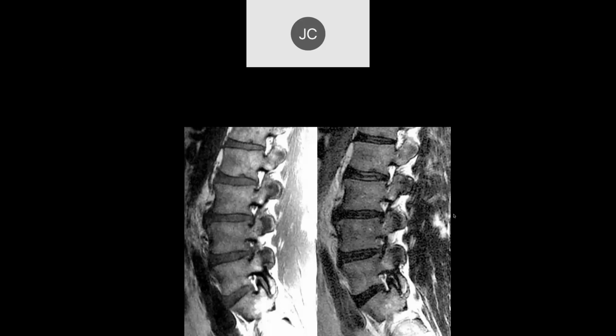All right, so a couple more sagittal MRs. Looks like L4-5, there might be some disc material in that. Yep. So whatever you do, spine folks, I think you really need to look at the T1 weighted images in the sagittal plane and look at the foramina and make sure that the fat within the foramina is symmetric at all levels.